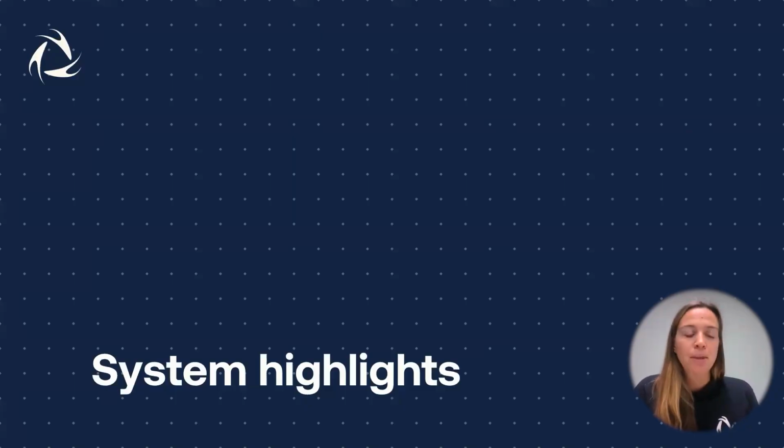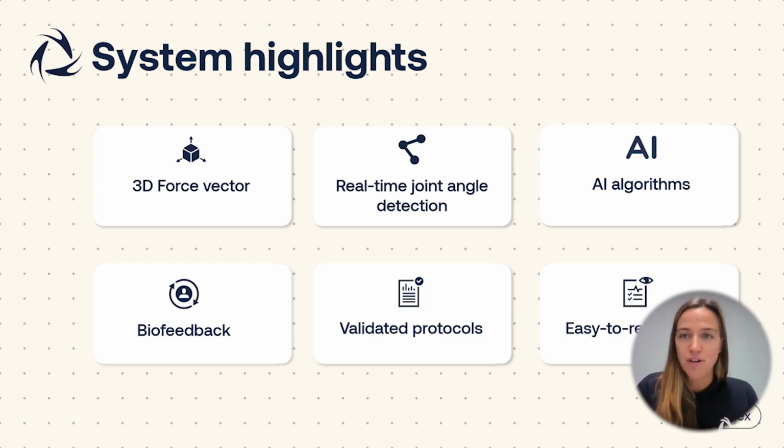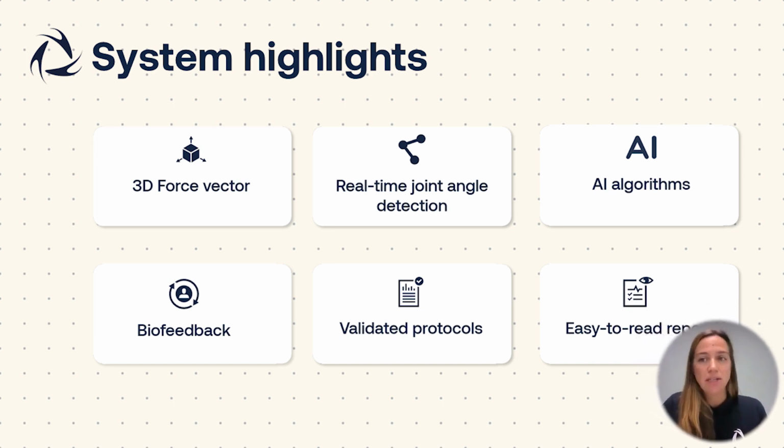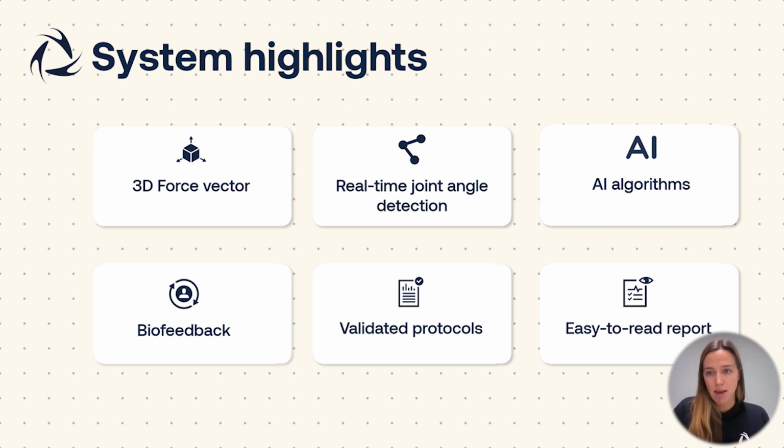In terms of system highlights of this new version of Podium, one of the standout features is the integration of synchronized cameras. Usually there are two cameras, one on the frontal and one on the sagittal plane of the body of the subject. This advanced setup enables the visualization of force vectors and joint angles superimposed on the athlete in real time.